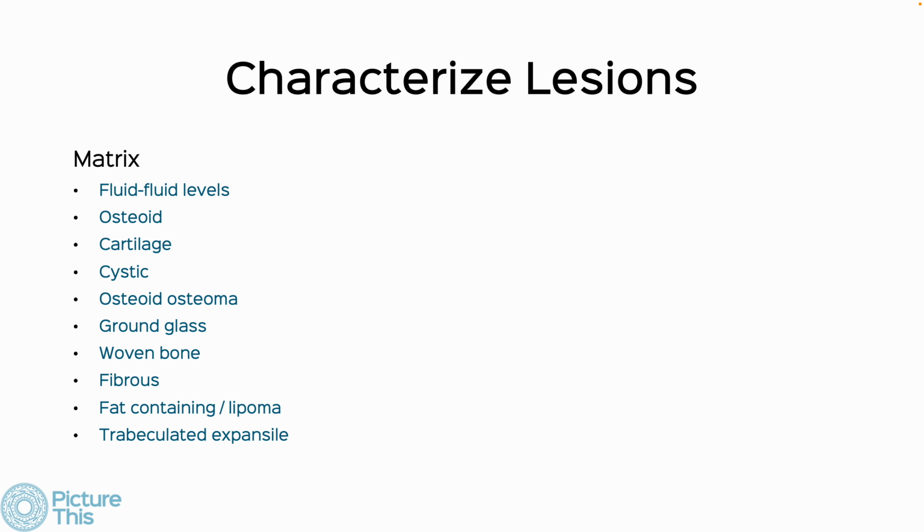So till now, what had we done? We started with characterizing benign versus aggressive. Then we said we'll do an MR. If it's aggressive, then you need to do a whole bone T1 or a whole limb T1, etc. And then we said maybe we can narrow down the differential by looking at the location in the longitudinal plane, then in the transverse plane, and is it a tibial lesion or a humerus lesion, etc. But then we can look at the lesions itself.